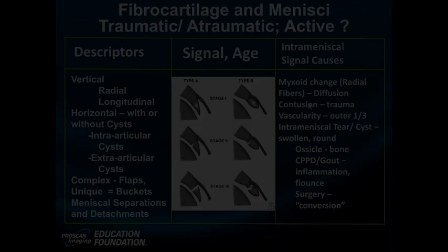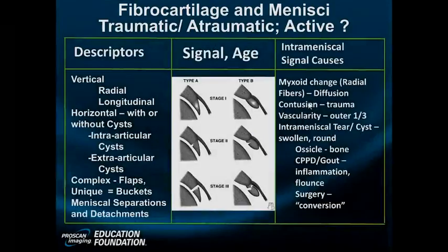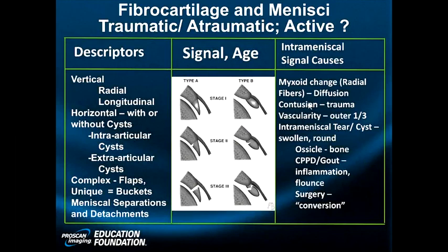In other words, the meniscal edge is rather wavy like this, and it gets pushed back by some synovium and capsule, and then it even gets bent a little bit, folded a little bit like a bow tie, and it's truncated at its edge. That's very common, especially with people that have synovial hypertrophy or a little bit of fluid, and it is said to be an indicator of a hypermobile meniscus.